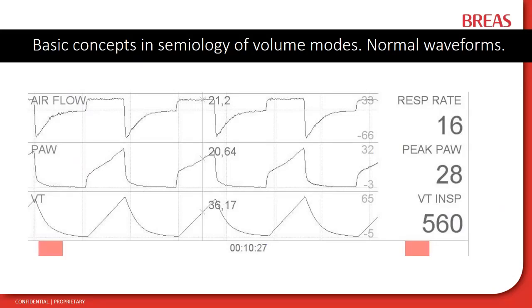Let's start with the basic concept in semiology of volume modes. In this slide, you can see the normal waveforms in volume mode: flow, pressure, and volume.